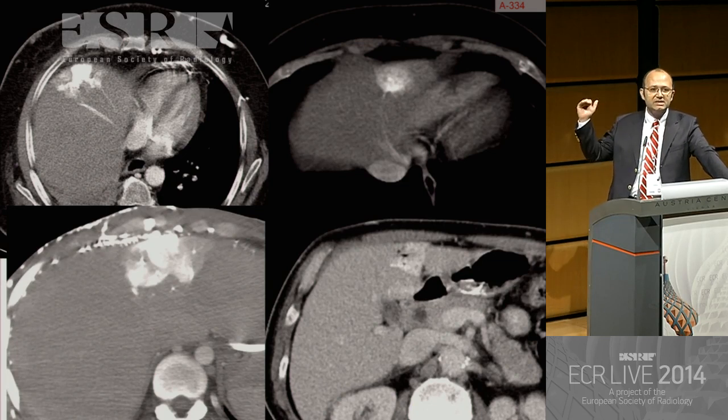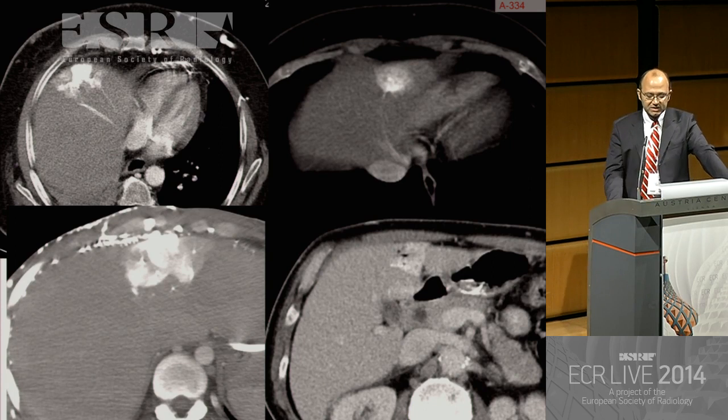First, when I saw these kind of lesions, I was kind of puzzled because I didn't know what to call them. And you can see that most of them are in the segment 4, and you see different things. But just look at the subcutaneous fat. You see some vascular structures. This is due to the occlusion of either the inferior vena cava or superior vena cava, and you have a retrograde flow into the liver, and this is called third inflow.